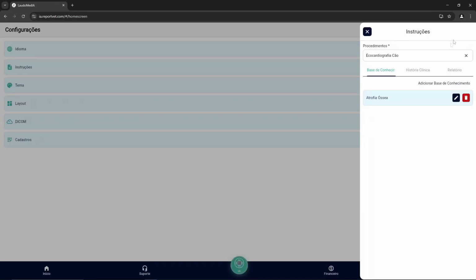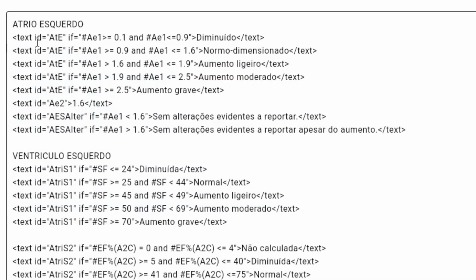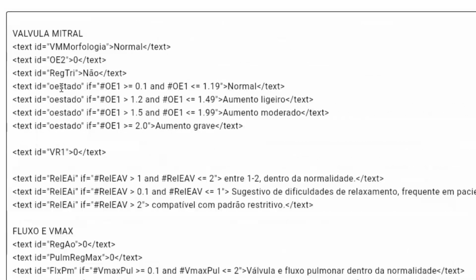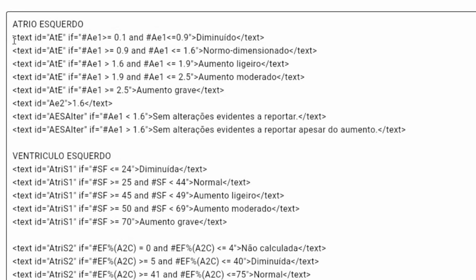You can define your own reference measurement tables for Lumini to analyze and adjust reports based on the provided data. This is the system's logical structure. If Lumini detects a measurement outside the normal range, it will automatically adjust the report and update the findings according to the predefined instructions. Since Lumini is an AI, it generates text based on the knowledge it has acquired from user-provided data.